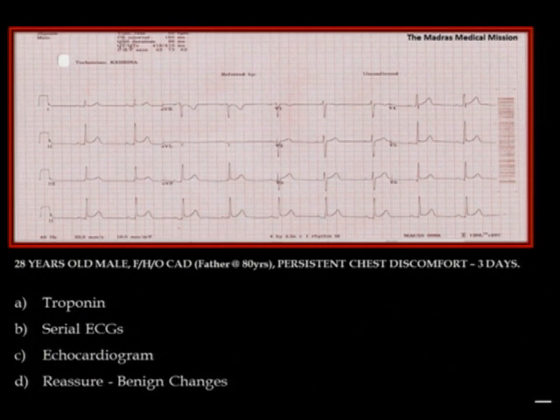So even though there is a tendency that there is an ST segment elevation in V2, V3, they are not more than 2 millimeters. And looking at the inferior leads, again there is a kind of a tendency for an ST segment getting elevated. Again, look at the pattern, it's a concavity upwards. Again, there in the inferior leads, well, 1.5 is good enough, but it is not even 1.5.